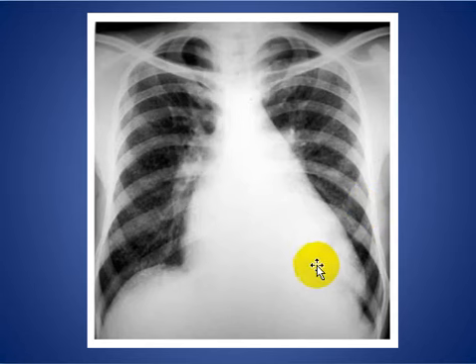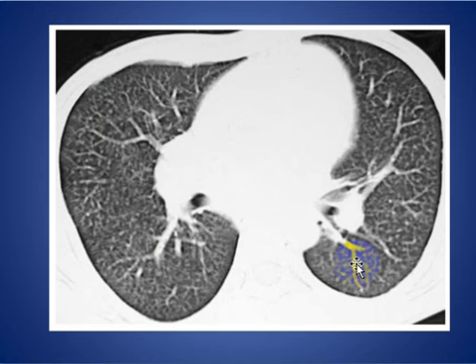Here, this is another patient with cardiomegaly, straightening of the left cardiac border and enlargement of the main pulmonary artery. And we see in this patient multiple fine nodularities involving both lungs. This was confirmed on the CT scan in this patient, and this is due to secondary hemosiderosis due to mitral valve disease, and the patient can present with hemoptysis.